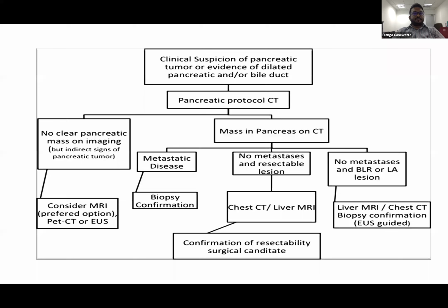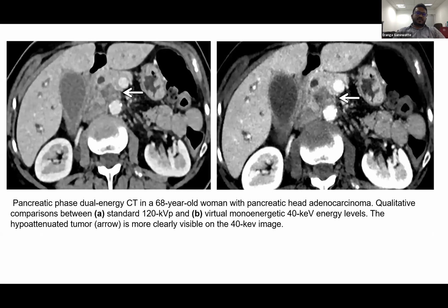And there are a few slides that I have prepared. Yeah. So in this, you can see the pancreatic tumors easily.